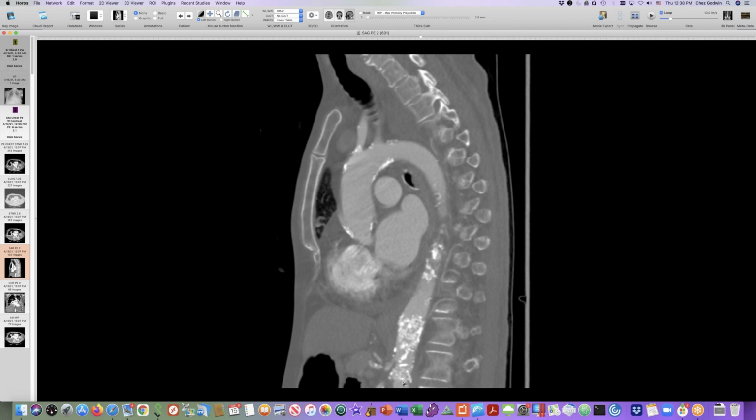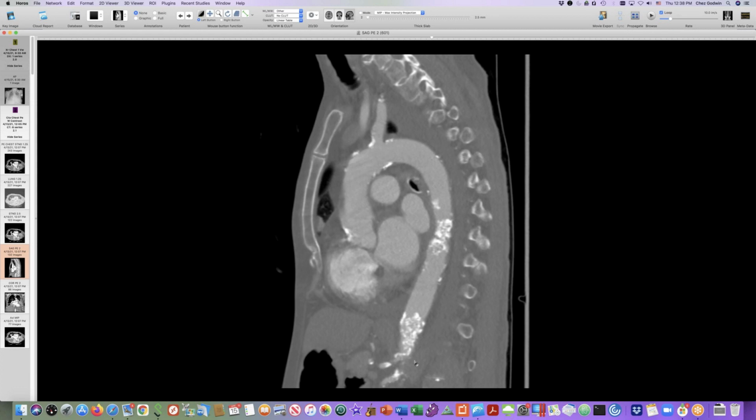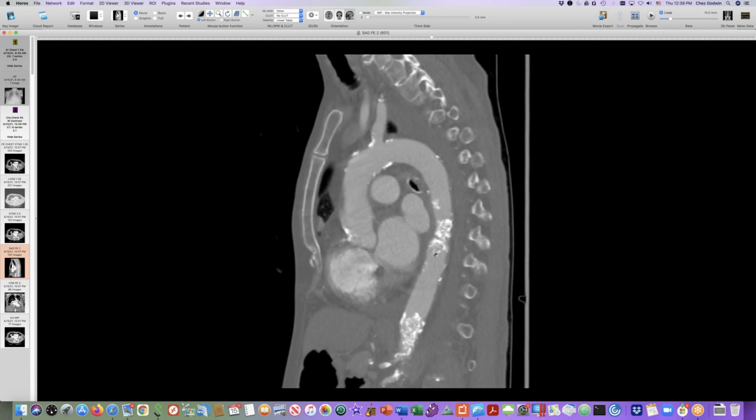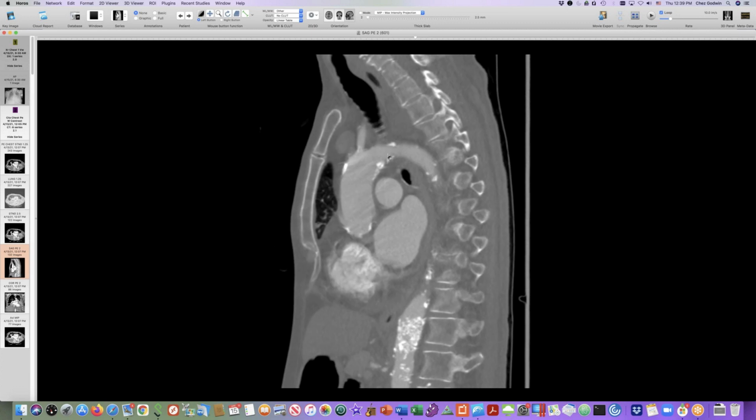Yeah. Okay. Is there any way this could be tumor? It seems to me tumor would be occlusive. Yeah, unless you have a metastatic bone or cartilage forming sarcoma, or an aortic sarcoma that differentiated. But usually, we've seen a couple of aortic sarcomas on here that looked really ugly, with a lot of irregular soft tissue. And I would think the vessel would expand a little bit too. But I was wondering if this was a weird sarcoma with some kind of matrix. When you first showed it, you mentioned tumor. Yeah, well, that was our best guess looking at it before.